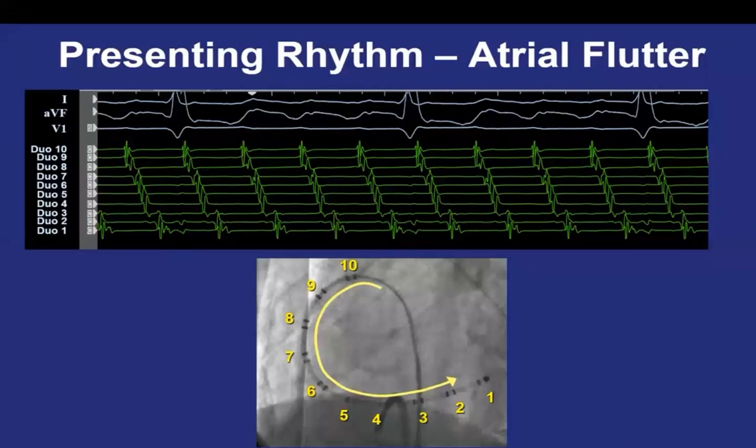In this tracing, Dr. Ahmed, is all this atrial activity or atrial flutter activity, because we can differentiate the QRS complex? What is this? This one? And what is this? So, yes, in a situation like this, follow the surface ECG and put a line. Surface ECG, put a line.